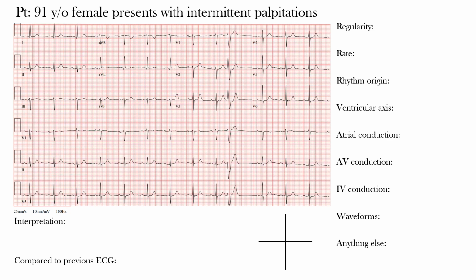Now before we get started, let's review the approach we've been using to interpret EKGs. So notice we have the patient's clinical presentation, then the EKG below it. On the right side of the screen, you'll see a list of different areas of the EKG that we'll go through before making our final interpretation.